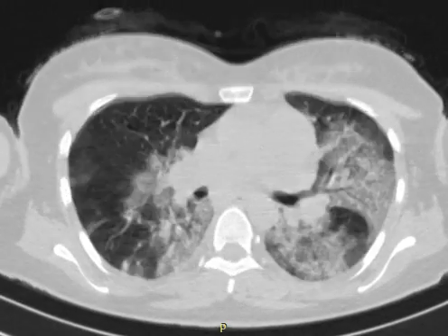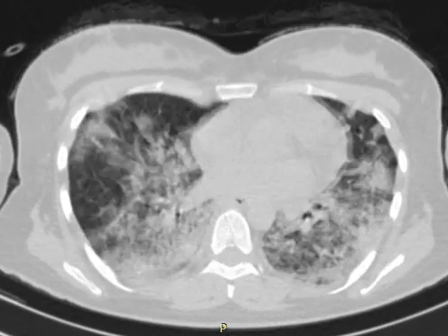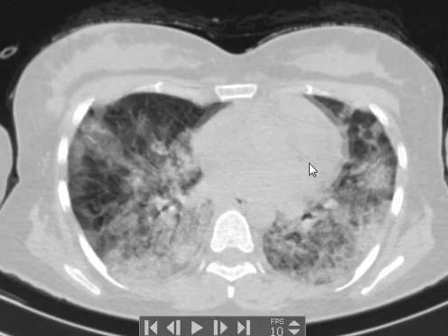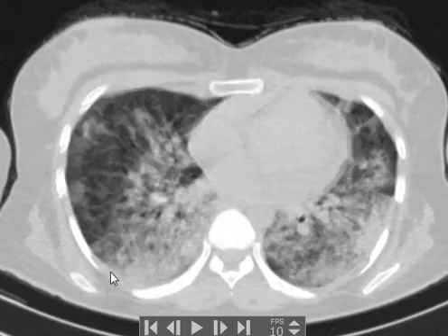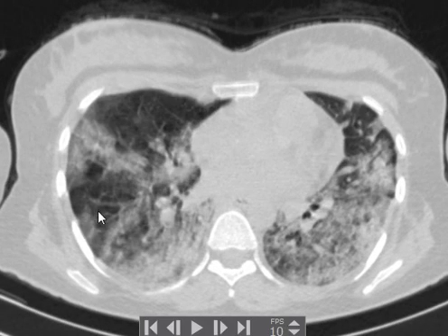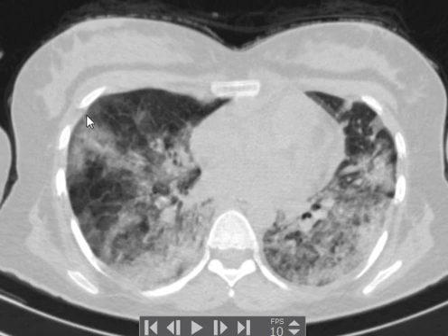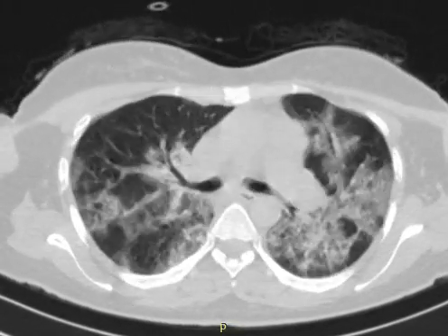The thing is, if you look carefully, you can notice there is a diffuse bilateral interlobular septal thickening that you can see between the lobes, like here and here. This pattern, between the patchy ground glass areas, there is interlobular septal thickening, with the patches being relatively, let's say, partially well defined. This indicates what's called a crazy paving pattern.